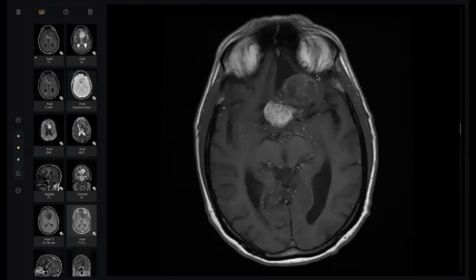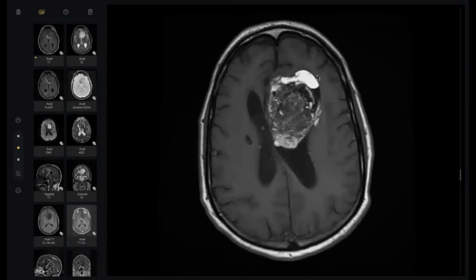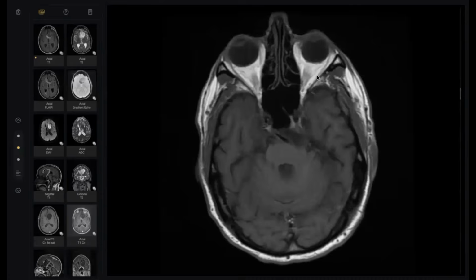Look here, please. I can see small hyperintense foci scattered along the... What does it mean for you? This is pointing to rupture dermoid content. Yes, rupture dermoid. I can see the hyperintense foci along the basal cistern, ambient cistern, and... What is your next step?